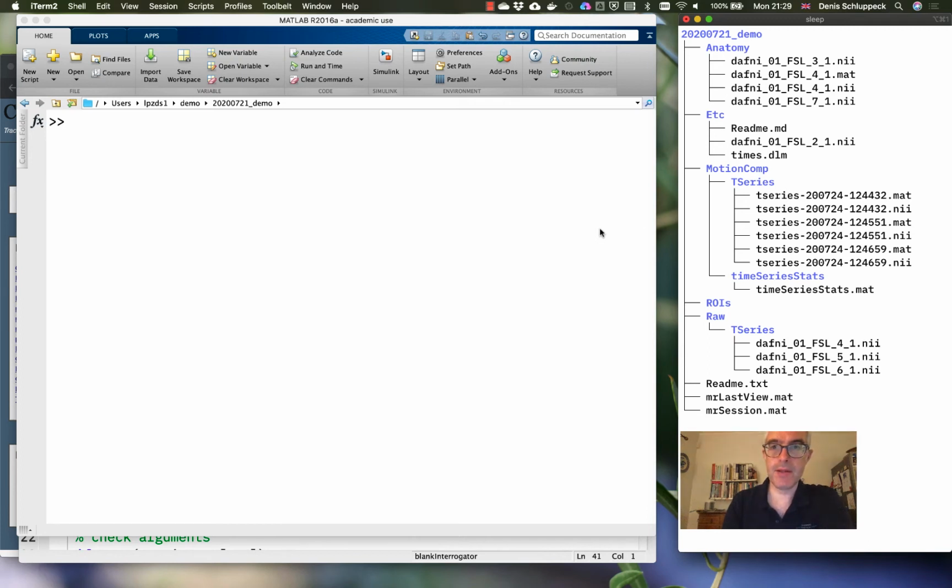Hi, in this video I want to dig a little bit deeper into this idea of these interrogator functions and how we can interact with the data set in a relatively straightforward way. I think that's one of the really cool aspects of mrTools and mrLoadRet, that you can execute relatively complicated things and interrogate your data set by clicking on voxels, right? And so you can get out much more than just a time series.